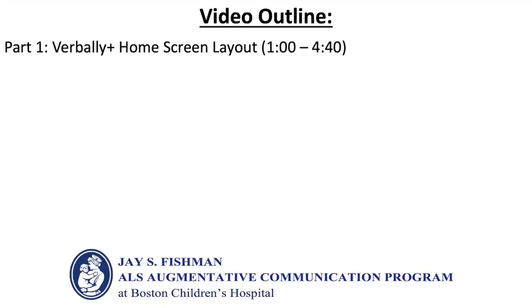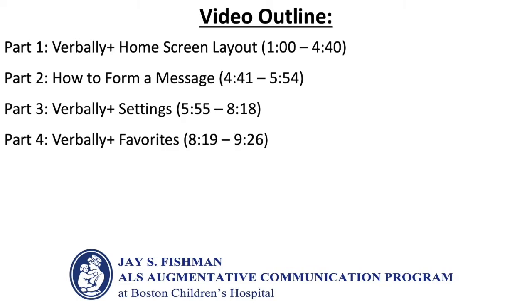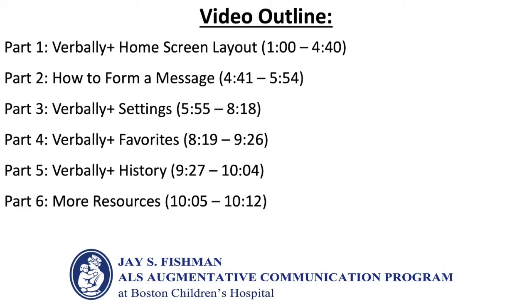The first part of this video will review the Verbally Plus home screen layout. The second will review how to form a message. The third will cover the Verbally Plus settings. The fourth will review the Verbally Plus favorites section. The fifth part of the video will cover the Verbally Plus history section. The last part of the video will provide additional resources for the Verbally Plus application.